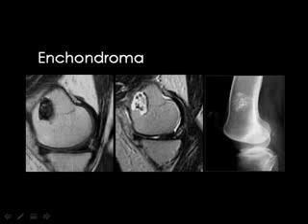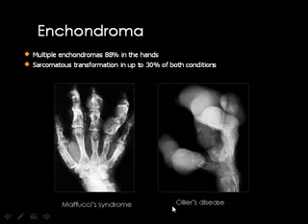If the enchondroma occurs in the long bones, you can also easily see this lesion. You remember the calcified lesion in the medullary cavity of the knee, and this is the classic appearance by MRI. The lesion is black in the T1, bright in the T2, while the matrix calcification will appear black in both T1 and T2. The sclerotic cortex will appear clearly in the T2 weighted image.